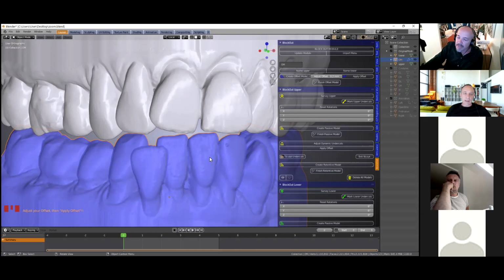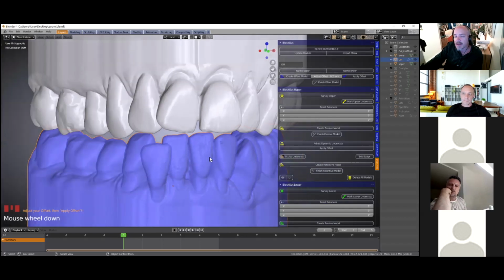It is a topic out there that zirconia crowns can sometimes be quite high in bite, so this is a way you can go around it. That's correct.